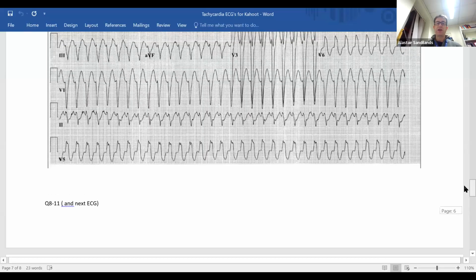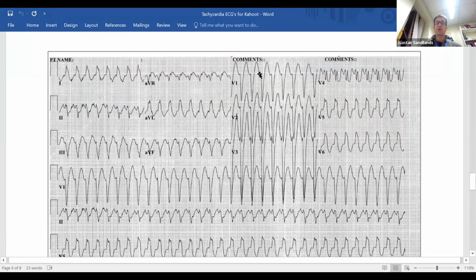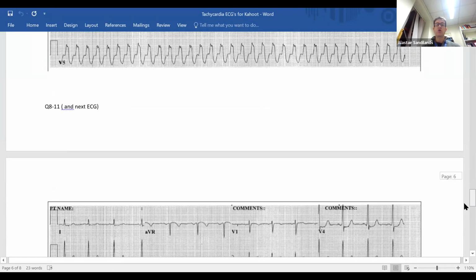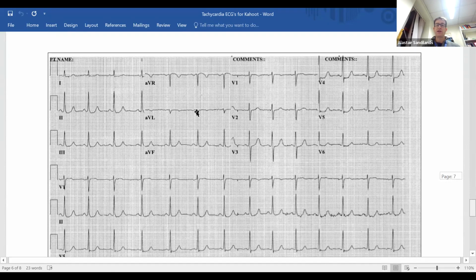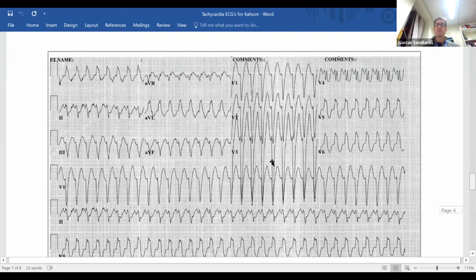So in tachycardia, we go back to the tachycardia. It's regular, broad. Does it look like left bundle branch block? Yes. Negative, broad, negative in V1, positive at V5 and V6, and left axis deviation, supporting left bundle branch block in tachycardia. When the patient goes back into a normal rhythm, the ECG is normal. There is no delta wave. This is not Wolff-Parkinson-White. There isn't a broad QRS here. Therefore, this is SVT with aberrant conduction because it looks like bundle branch block.